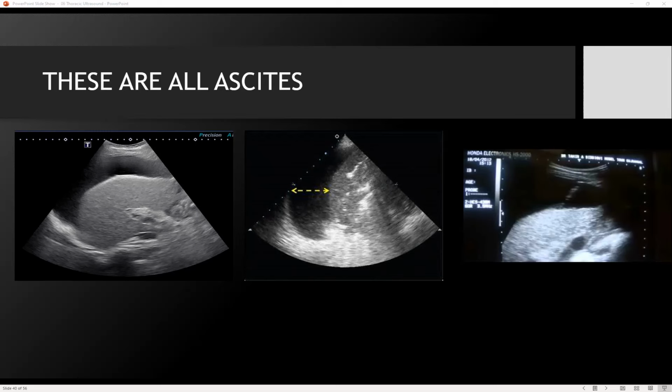Colleen also made a comment. This is a more serious mistake when performed on the left. There have been cases of blood in the ventricle mistaken for pleural effusion. I would also argue you'd better prove it's definitive of pleural effusion if you are below rib 8. Thank you, Colleen.